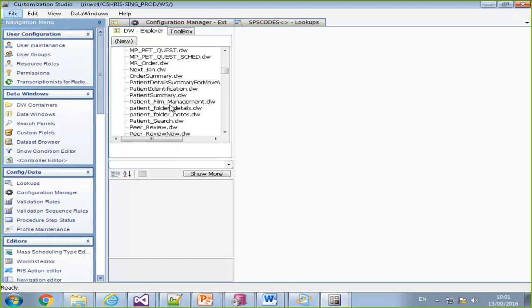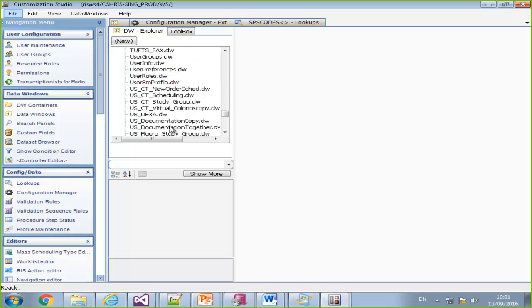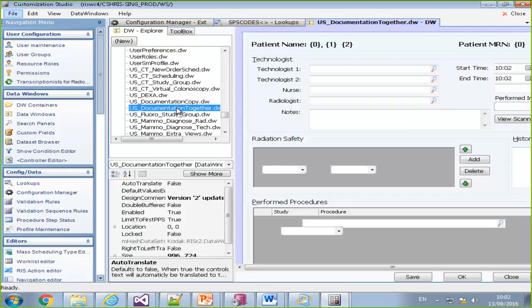Sometimes it's one of those procedure codes that can span multiple studies. Maybe they use inventory items as a procedure code and they want to add this inventory item to the procedure grid. So it's not necessarily associated to the study, so you need that ability to add it associated to a particular study. That's the scenario in this case.